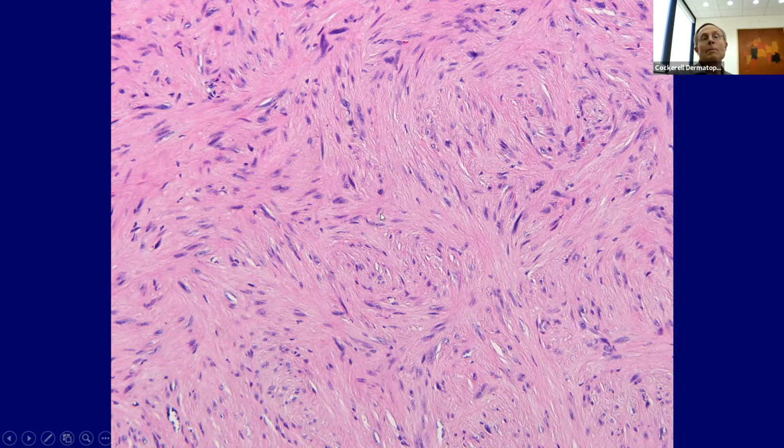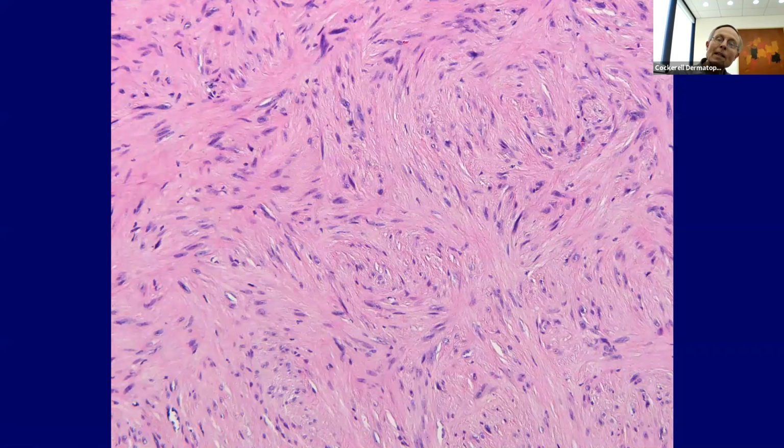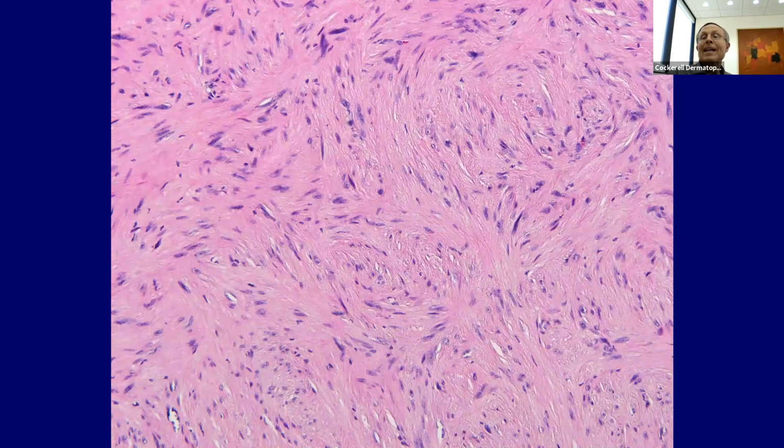So when we see that, what do we think about? We think about muscle. Good. And so a couple people said leiomyoma, and somebody put pilar leiomyoma. Now, what's not so great about a piloleiomyoma? What's the difference? So there's three main types of leiomyomas in the skin. There's the pilar type, which comes from the arrector pili muscles. There's the scrotal type, or the erectile type, which comes from scrotal tissue or erectile tissue in the labia, for example, and the dartos muscle. And then you've got another type, this type, which comes from blood vessels, the angioleiomyoma type.